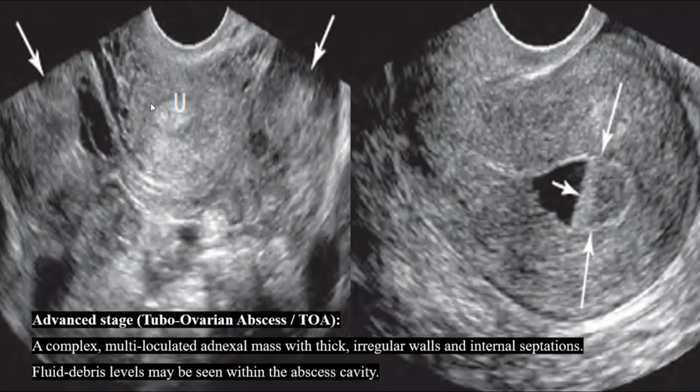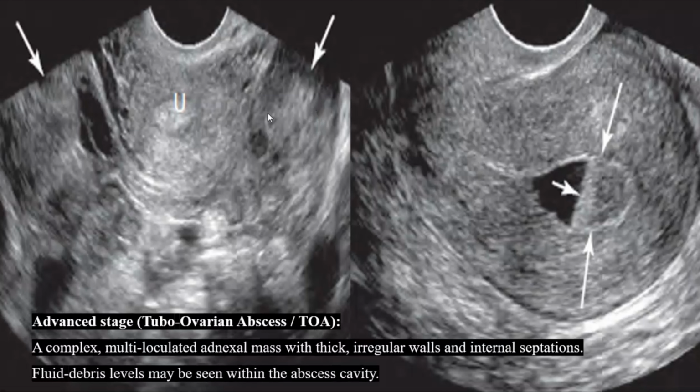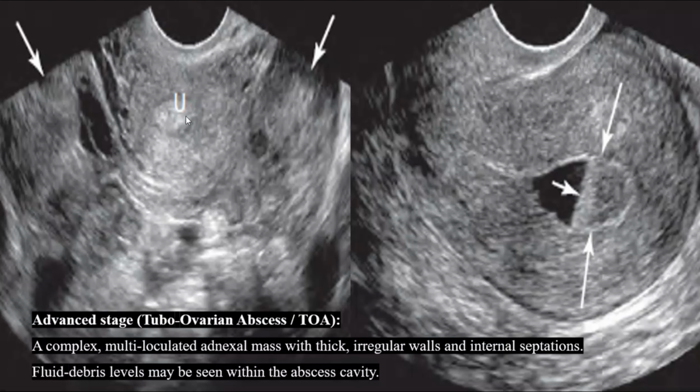Here you can see a transverse transvaginal image of the pelvis, and here you can see the uterus, this one is the left adnexa, this one is the right adnexa, and this image shows bilateral adnexal masses, and these adnexal masses are due to pelvic inflammatory disease. And here you can see that the margins of the bilateral ovaries are not clearly visible, and it is due to the surrounding inflammatory material.